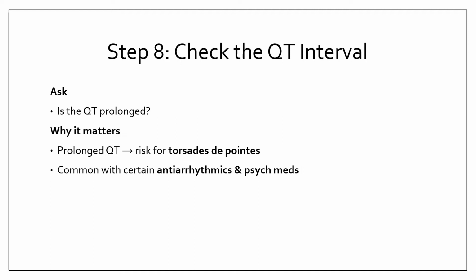This step is going to be a patient safety pause. So we're asking, is the heart taking too long to reset between beats by checking the QT interval? And if it is, the patient's at risk for a dangerous rhythm. So asking ourselves, is the QT interval prolonged?